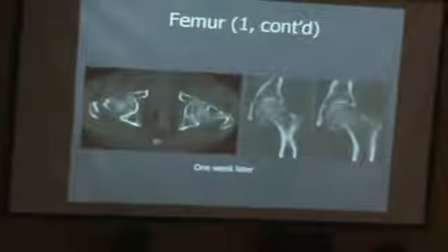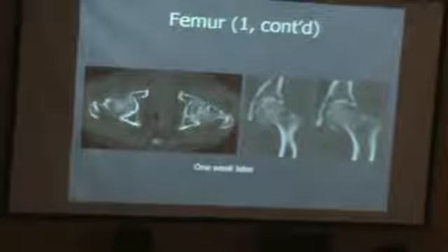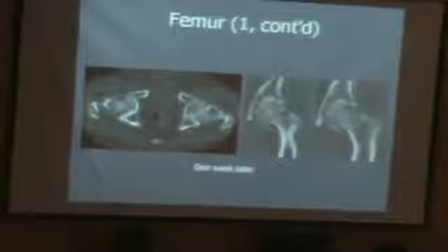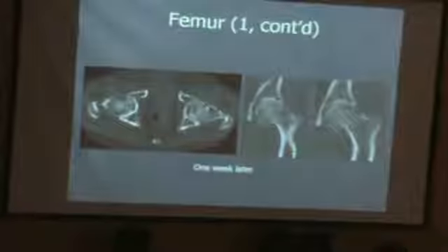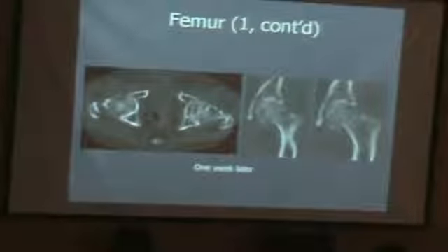One week later, because the patient is still having pain, we brought him to the hospital. We got the CT scan, and as you can see, there is a line of fracture going through that herniation pit. Of course, you understand that it's so big that it makes the bone fragile, and that's what happened to the bone. It just broke into a fracture. So again, if you have a high suspicion of fracture in a patient with pain, traumatic or atraumatic, get him a CT scan and MRI, because that's what you're going to find at the end.